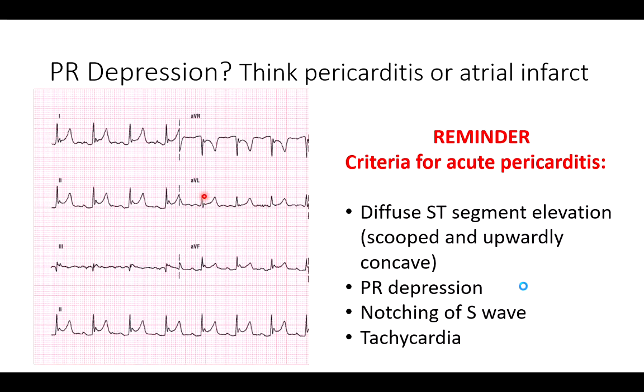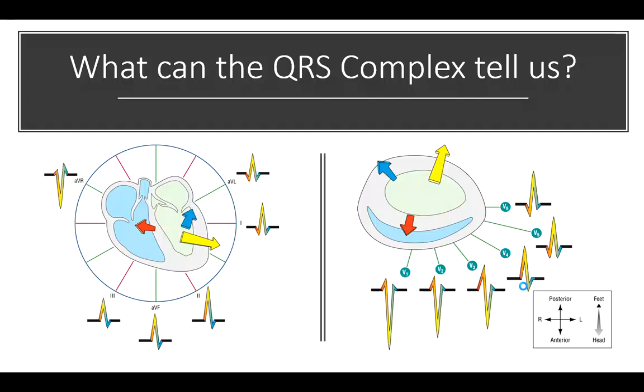If we looked at this and said 300, 150, 100, it's pretty close to a rate of 100, a little bit less, so it's not quite tachycardia in terms of a textbook definition. And again, it's something that we're going to want to look at in multiple leads. We're getting pretty close to meeting all these criteria, so I'm starting to get a hunch.